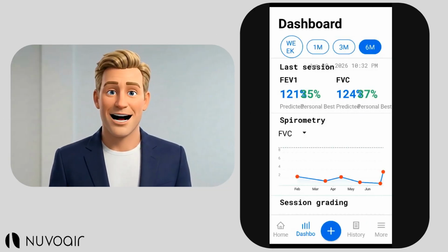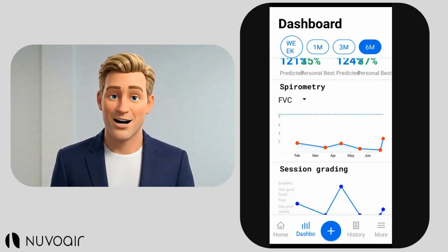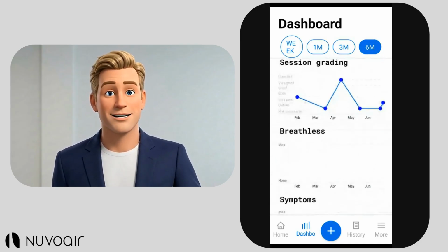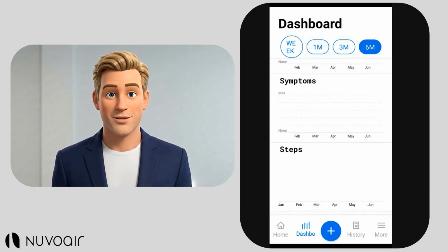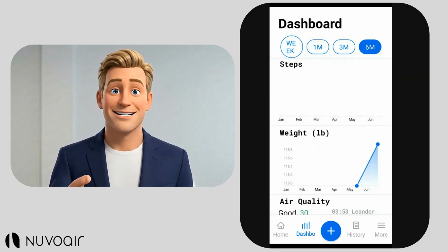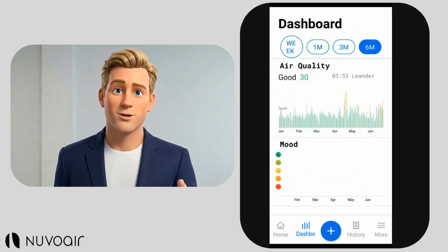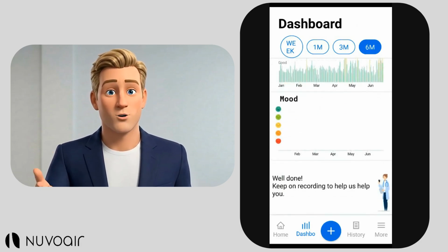Ready to check out the dashboard? Think of the dashboard as a way to visualize the last week to 6 months of testing. As you scroll down, you will begin to see test results, session grades, some questionnaire results, your air quality, and other values.